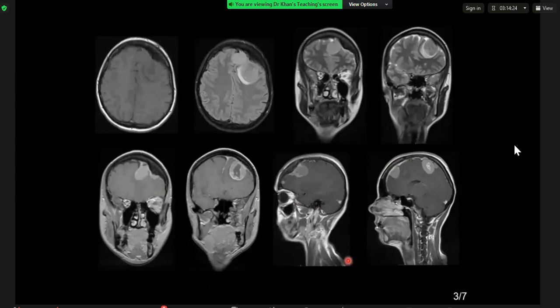Over to you. Okay, so on MR imaging, the lesions which you have seen on CT, first of all, they appear to be hyperintense on the T2 weighted imaging, and they have got a signal of high intensity on T2 at the periphery. That is the large lesion in the left frontal region, and there's only one lesion which has got a cystic change within it, and the rest of them haven't.